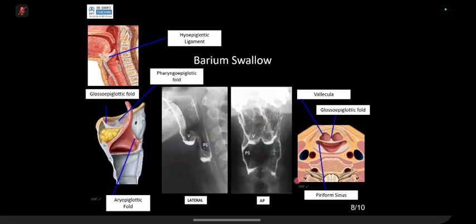In a radiology exam, we grill our students on this. I don't think so. This is ENT territory. Having said that, as gastroenterologists, you should know the anatomy. So look at this. There is an anterior structure, an anterior blindly ending pouch, and then there is the posterior. And this thing is in continuity with the esophagus. So the posterior one is the piriform sinus, and the anterior one is the vallecula.